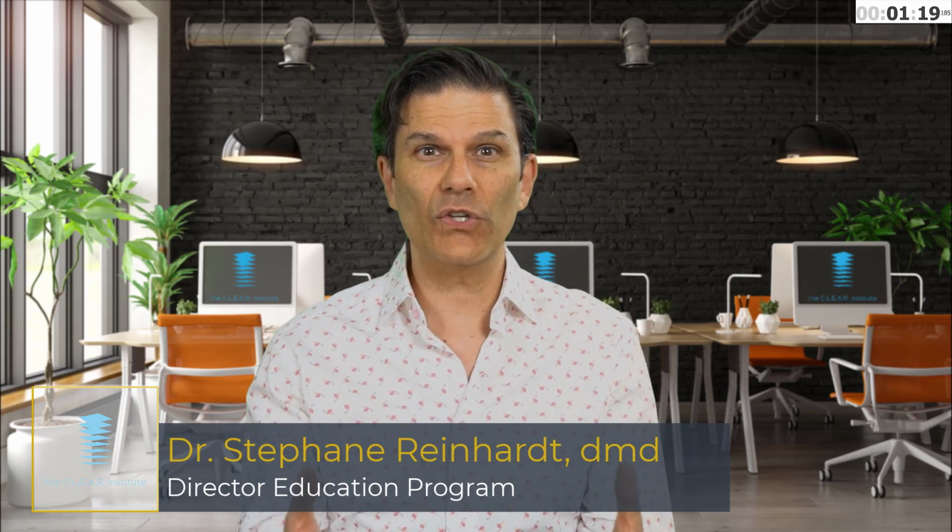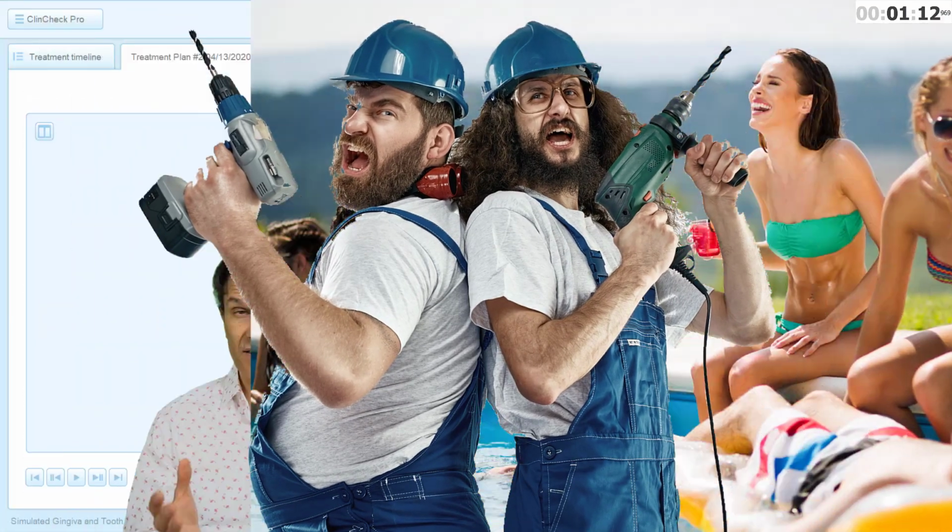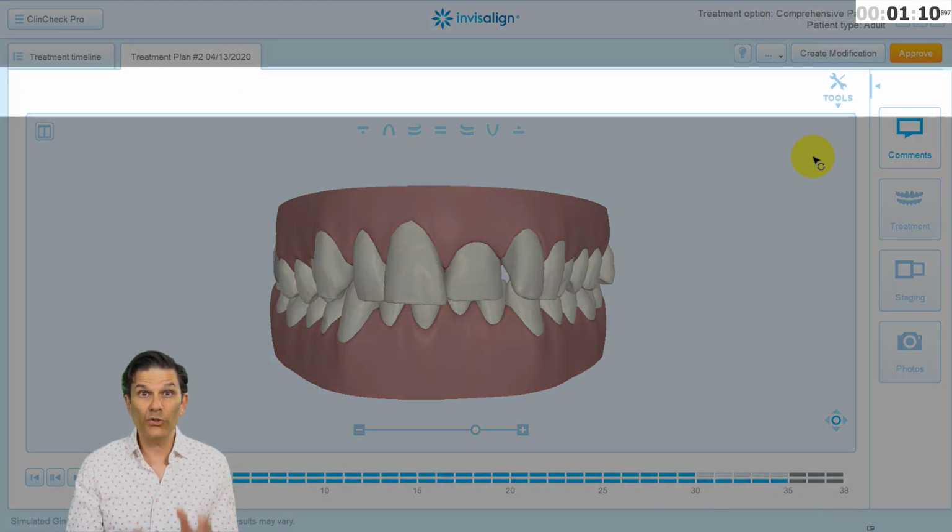You can customize your view to have the tools you usually use. My preference is to have them all. I want everything. Especially if I'm working on a desktop, I have the space, so why not have them all in there? Let's make a tool party. If you open your ClinCheck and it's like this, not even one tool is there.